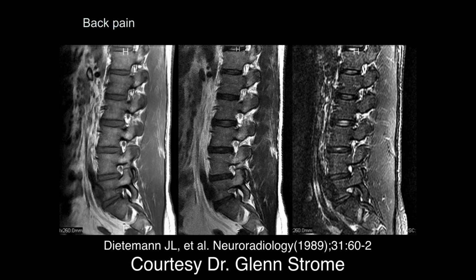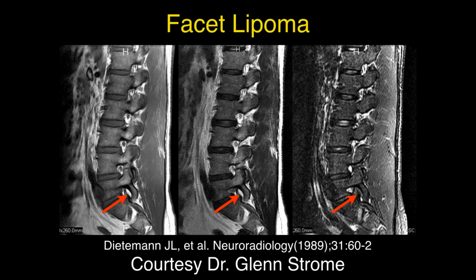So on the sagittal, it's hard to find it. Probably those are painful. Yeah, facet lipoma. This is a facet lipoma. I'm not sure if these lipomas are painful.